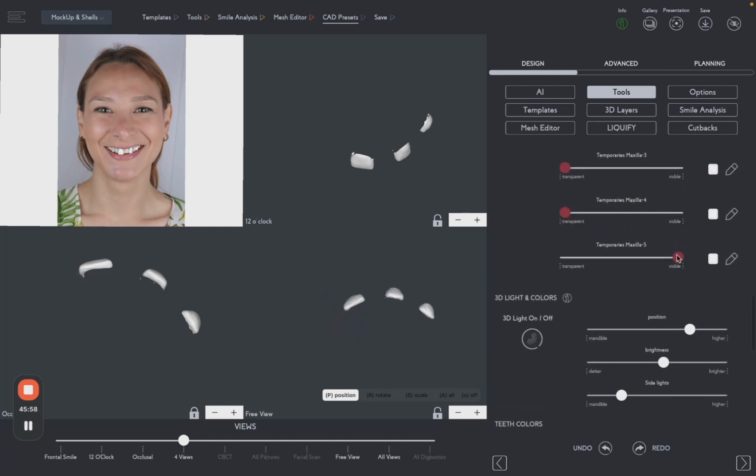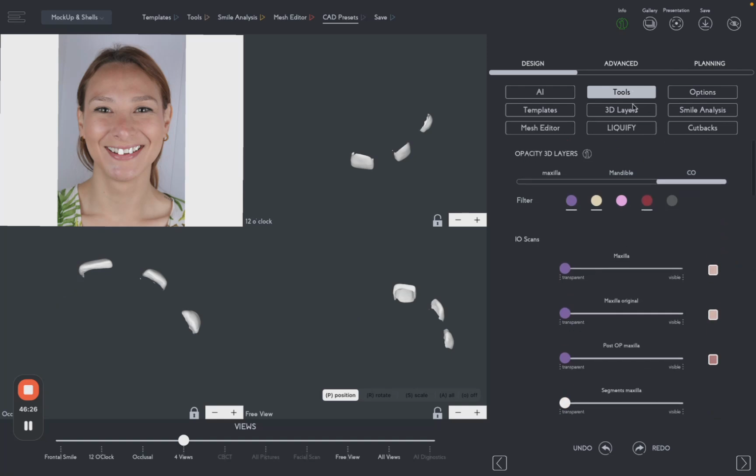If I go all the way here, you can see that this is the only file that I have, and it's with 3 units. They're all separated. And this is the other 3 units as a bridge. And you can have these either linked because I selected all of them, all of the 3, or you can have them separated like so.